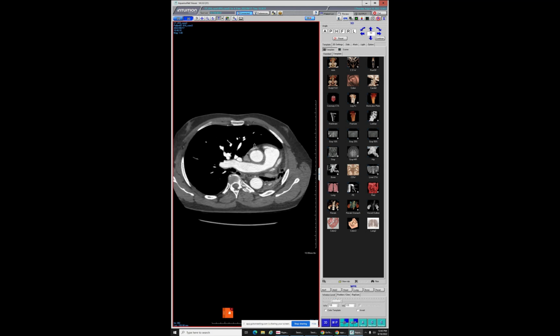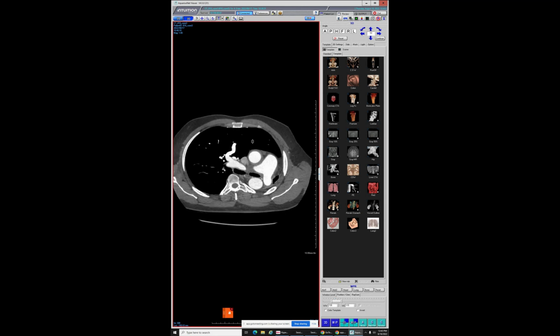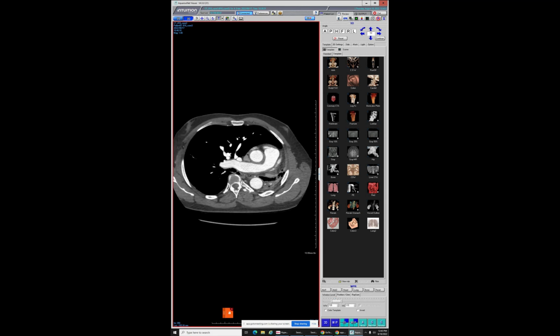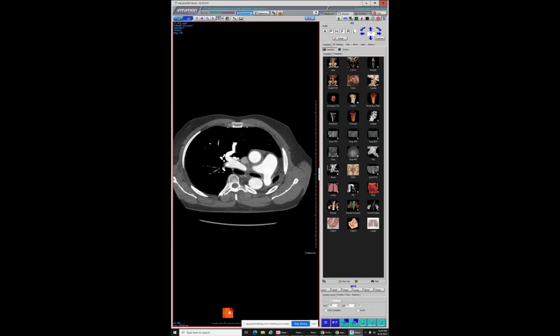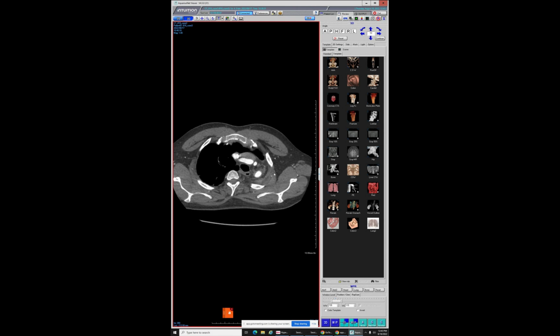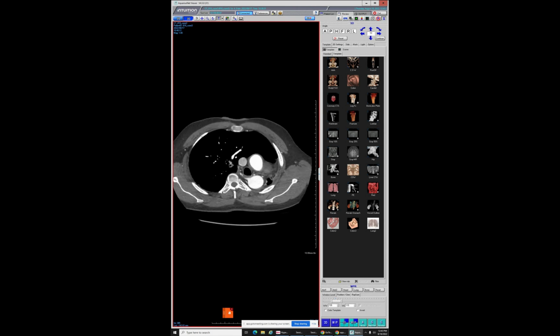But anyways, I'm still not sure whether the left PA finding was due to a very early manifestation of vasculitis. Again, the vasculitis didn't pop up till around 2015, and supposedly this finding had been there since 2006 or 2007 when he first underwent imaging, so probably longer than that. Or if that's related somehow to the coarc. Anyways. So Seth, what do you think destroyed the left lung?